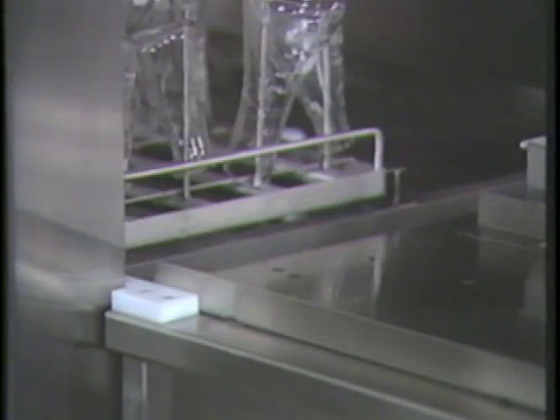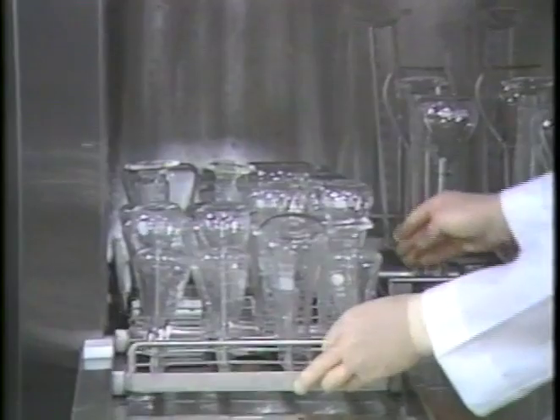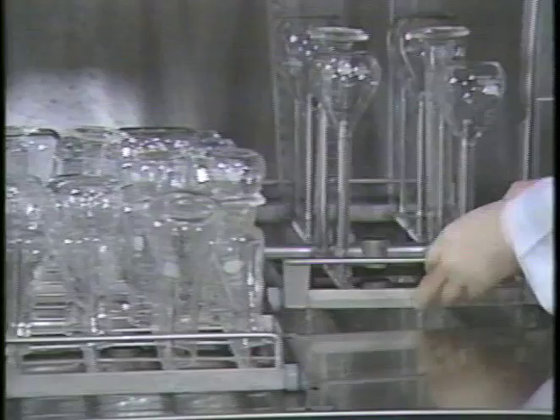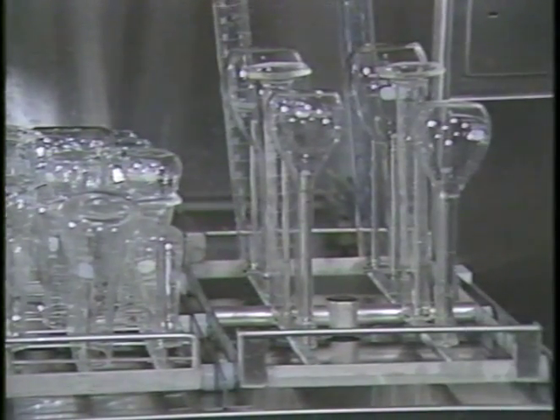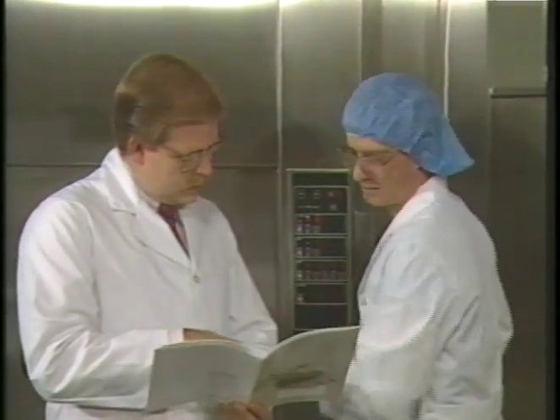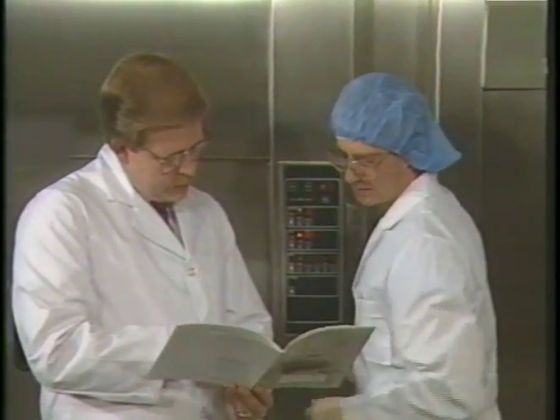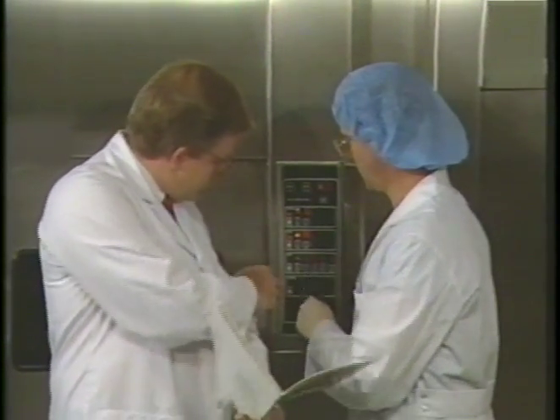An unloading cart that fits snugly and securely parallel to the opening of the access door of the washing chamber should be utilized to avoid back strain and injury. Items should be allowed to sit and acclimate until they're completely cool in an environment that's at a similar temperature to discourage recondensation on the load. All personnel operating the equipment must receive proper in-service training regarding equipment operation, safety applications, policies and procedures for use prior to running the equipment.